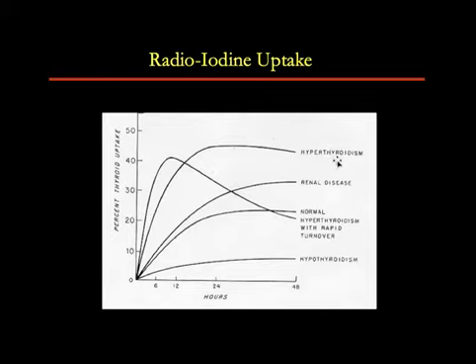Most of the time, patients who are hyperthyroid have a 24-hour uptake above 30%, which is seen here in this curve. It's above 40%. And there's a small subset of patients who we call hyperthyroidism with rapid turnover. In these patients, the uptake value goes above 30% in an early period, around 6 to 12 hours, and then may come back to a normal value of 30% in 24 hours. That is the reason why some centers also do a 6-hour uptake to catch those rapid metabolizers.